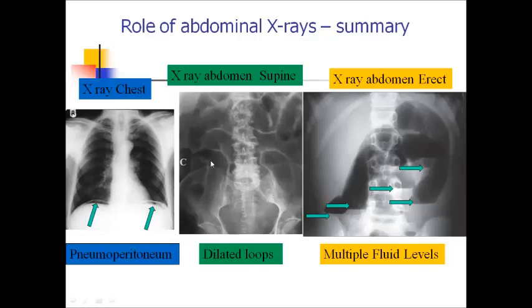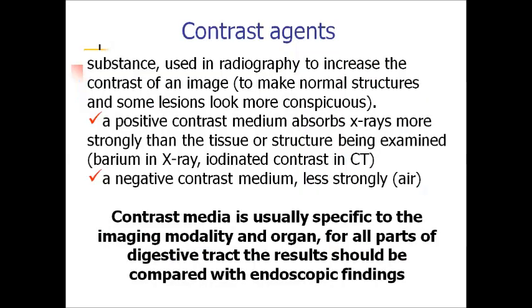For example, dilated intestinal loops or multiple fluid levels with accumulation of gas above these levels. Also signs of acute abdomen and intestinal obstruction.